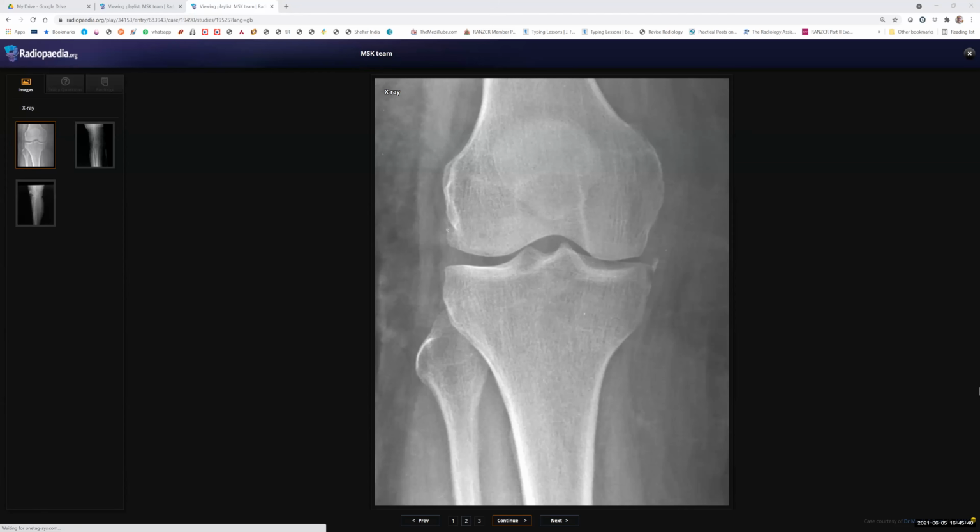This is a radiograph of the knee joint in which I can see that there's an avulsion of the medial end of the tibial condyle, and there's no joint space narrowing. That's not a periosteal reaction around that, I think. There's an avulsion injury of the medial tibial condyle. Which ligament is avulsed? Medial collateral ligament.